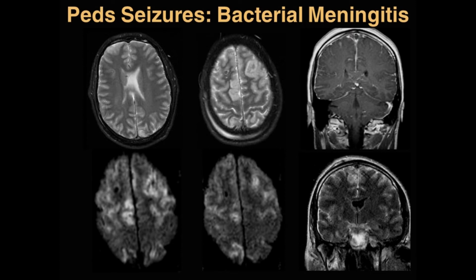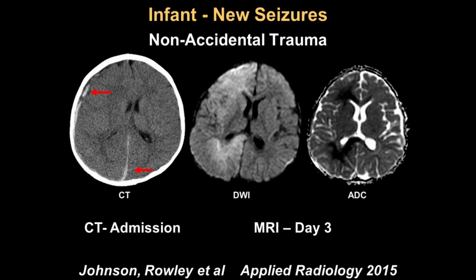We can appreciate at first glance on the diffusion weighted imaging, we have patchy areas of diffusion restriction corresponding to edema on the T2s, and there's extensive leptomeningeal enhancement on the post-contrast T1 as well as the post-contrast T2 FLAIR. So this is a don't miss diagnosis. You can imagine that the leptomeningeal inflammatory response here to the meningitis can cause secondary ischemia. So don't stop with the non-contrast scan. Contrast really helps you see the direct signs of leptomeningeal inflammation and directs you toward the meningitis diagnosis.